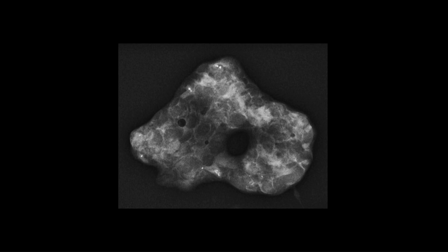If you didn't see it, you just weren't looking that carefully, or maybe, unfortunately, you skipped looking at the full pixel resolution. These might not have even been visible on the images looking at the whole breast, and they certainly wouldn't have been visible looking at the initial images where you saw the current exam compared with the previous, because then all the images are so small that pixel averaging has probably wiped out the visibility of anything there.